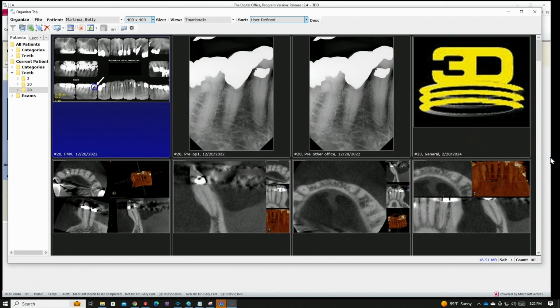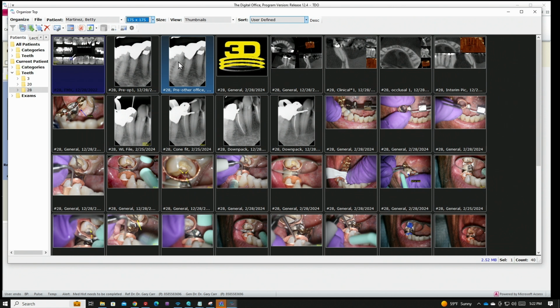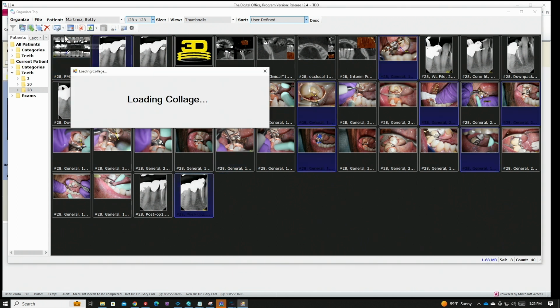So now we have to decide what we're going to do for the final report. We've got the case all in the image organizer, and those pictures are in by date and time, so they're in the proper order. And I'll typically go in so I can see all the pictures on one page. And then let's say you want to do an 8-pick collage to put in the report. So you go through it just as Yahuda did on the letters page, picking the pictures that you want, but you pick them ahead of time and you plan it.